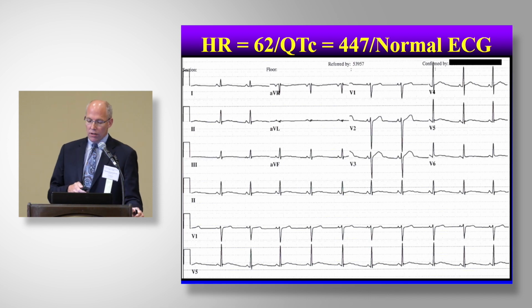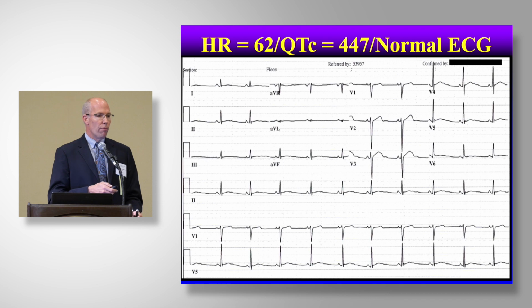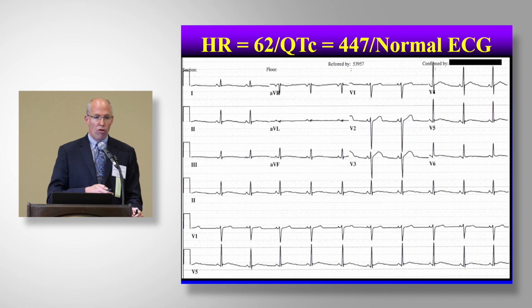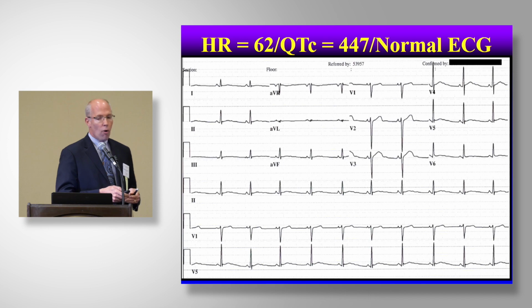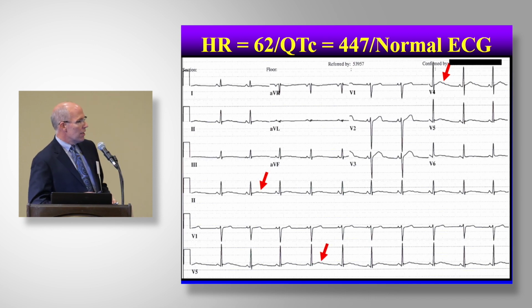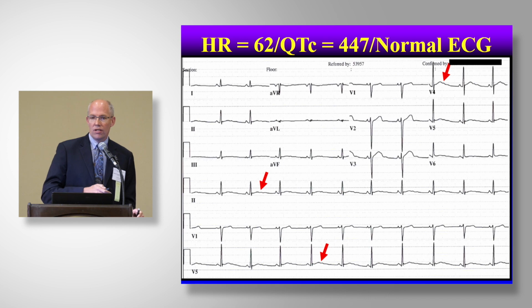Well, then when we look at the QTc, let's look at this electrocardiogram. You see what the computer said. You will know how to confirm the computer. In this case, I'll tell you the computer got it right, and the computer thought it's normal. Is this ECG normal? Well, despite a normal length of repolarization, there's nothing normal about the look of repolarization, as I'm evidencing here. And so as much as we'll focus on how to measure the QT interval correctly, there is the skill and the seasoning of the look of repolarization.